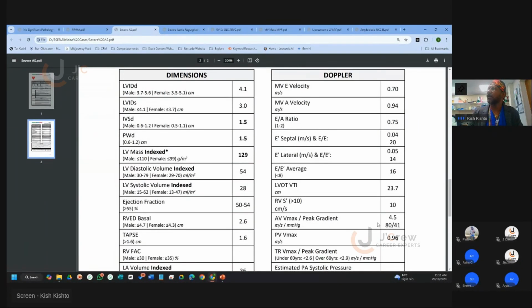So, any questions on this reporting so far? I think it was important for me to show you how they report and describe things here in context with the images. Happy, everyone?